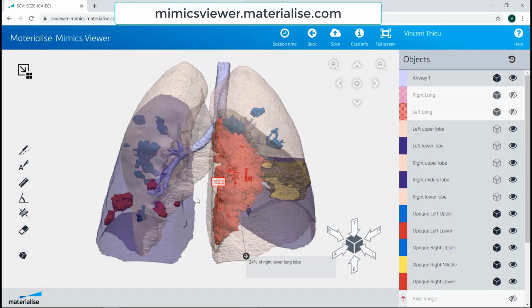Lastly, it might be beneficial to understand the 3D spatial relationship between different parts, such as the overall lungs and the accumulation of the opacities and consolidations. Certainly, transparency helps, but another tool that can be used is the section view, which allows you to cut through a section of the model and go through it slice by slice.